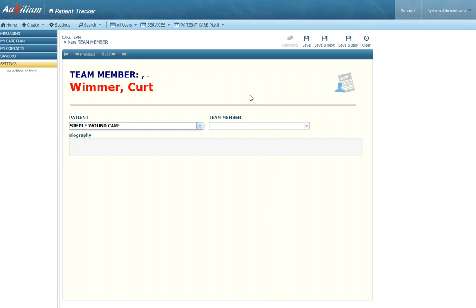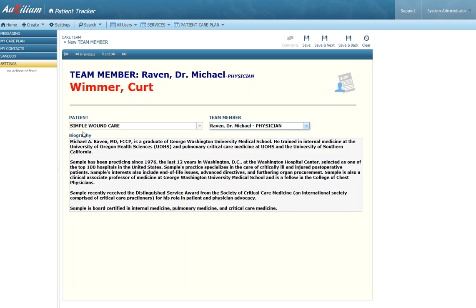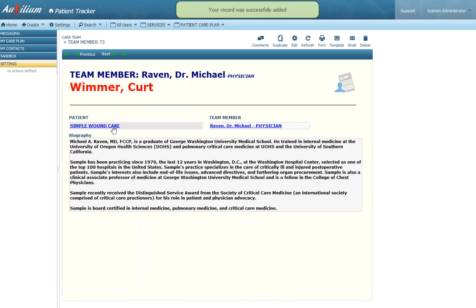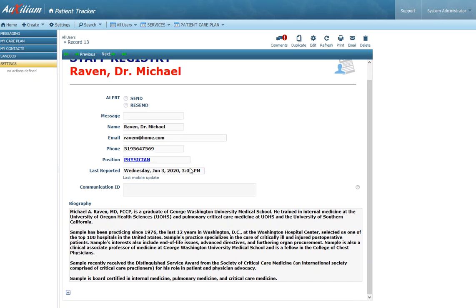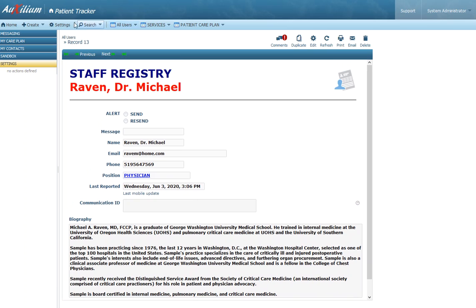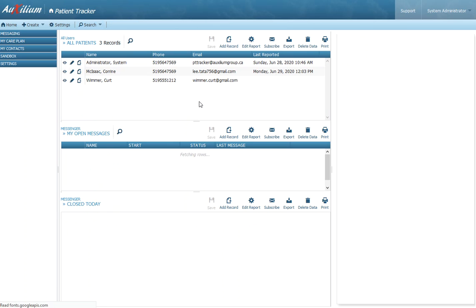So these are the internal care team members. We're going to put Dr. Raven on this, and here's a bit of a biography on Dr. Raven that you can choose to fill out and then have that information available to the patient. So we're going to save that information. Now we know who is part of this patient's team, and we can add as many team members to this patient as we so desire. So we go back to the main page.